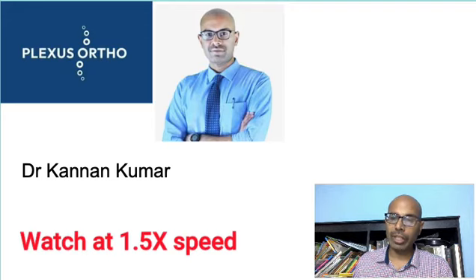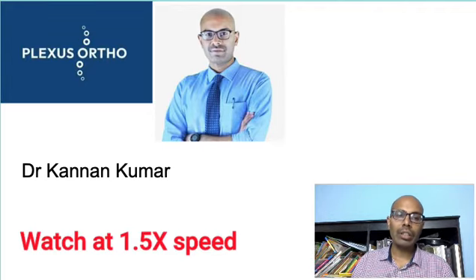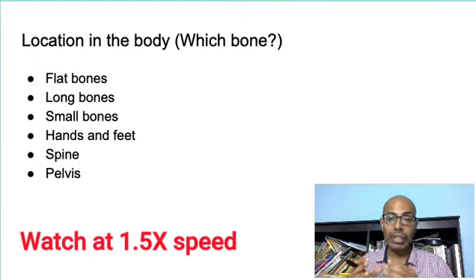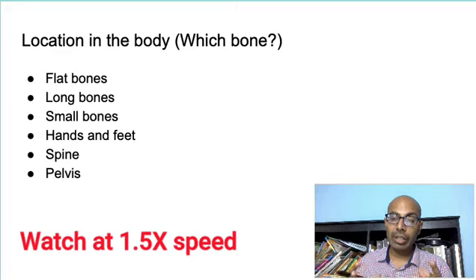My name is Dr. Kannan Kumar and today we're going to discuss an important topic for your NEET PG exams. The important topic today is how to read an X-ray in your exam when they present with a bone lesion. Nowadays a lot of image based questions are coming. You're getting at least one tumor question in every paper, so therefore you must understand how to read these bone tumor lesions and how to come to a diagnosis.